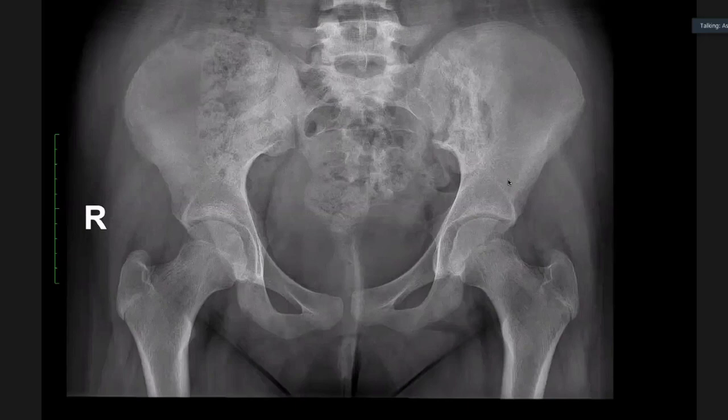So, what do you think is happening? What's the diagnosis? What's the differential diagnosis we have? So this is a mixed lytic sclerotic area, and some cortical break is also noted. Cortical break, you mean here? Yes, sir. Well, that's that area we have described, so don't go there again. But what's the important thing that we need to try to assess when we see abnormality on one side of the joint?